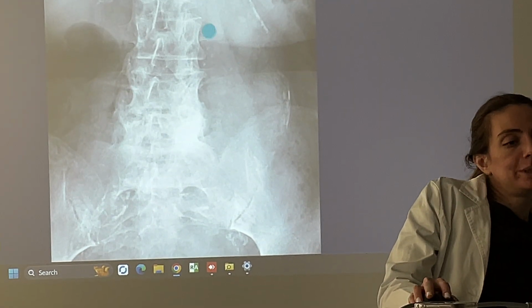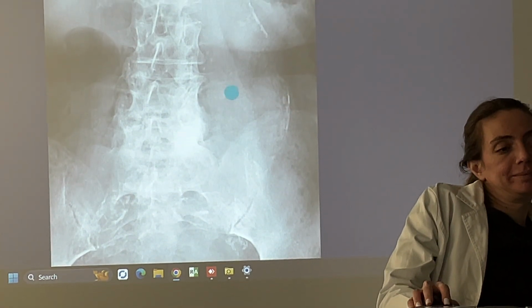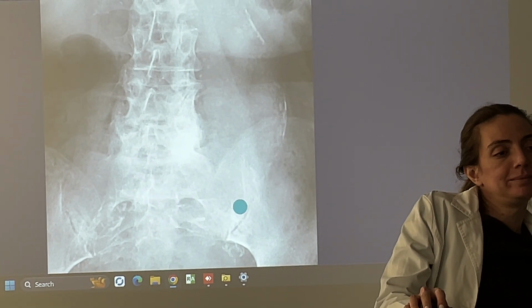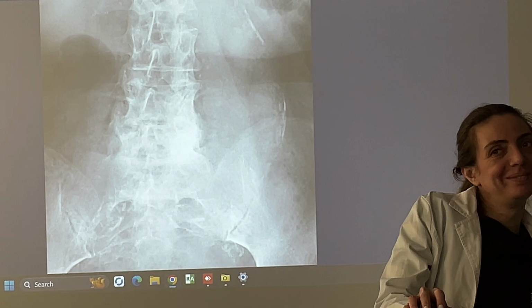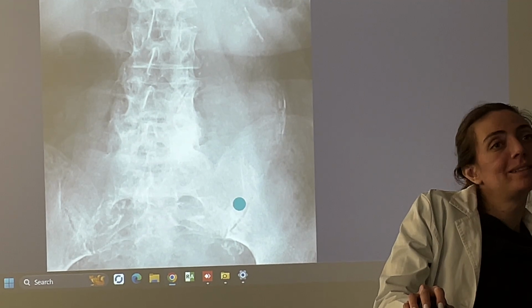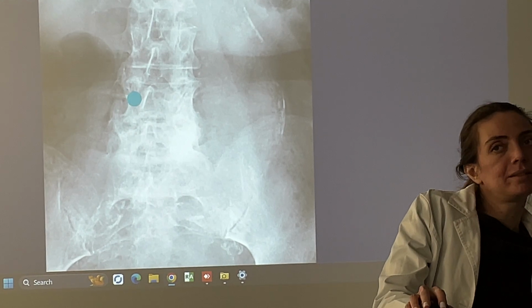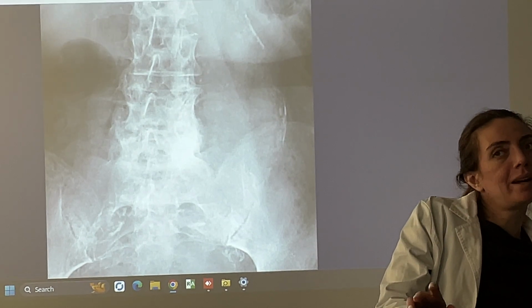How do we find it now? What is this? If this one is aorta, what is this? Esophagus? Oh, ureter is also there. This is the inferior vena cava. Inferior vena cava is behind, and the superior mesenteric vein is behind.